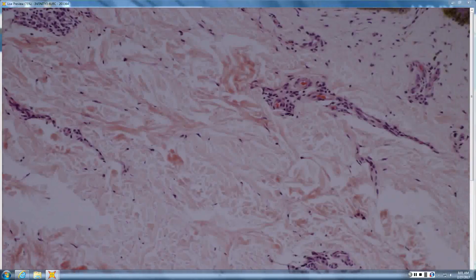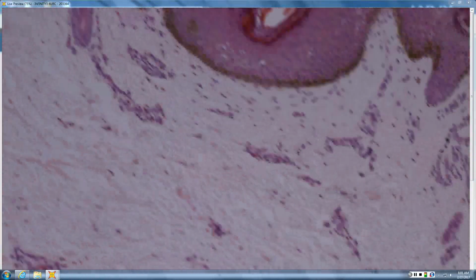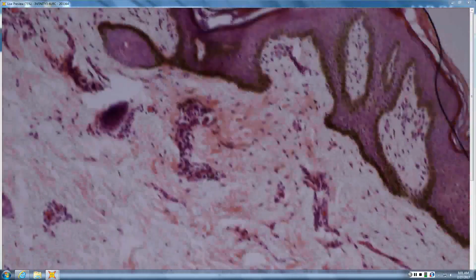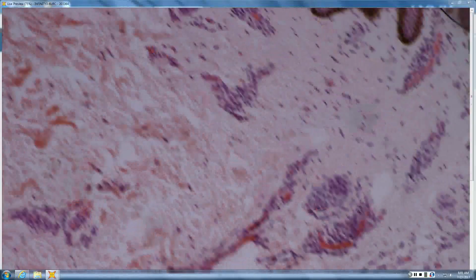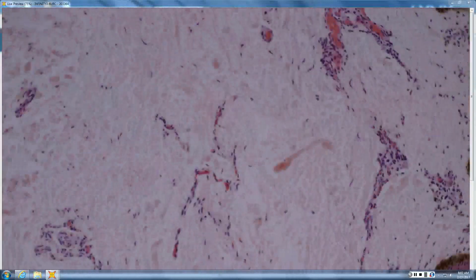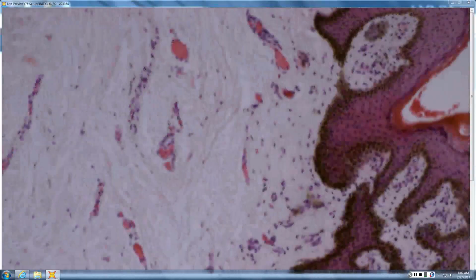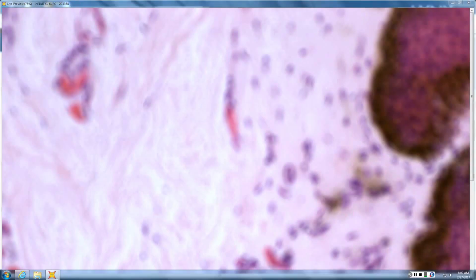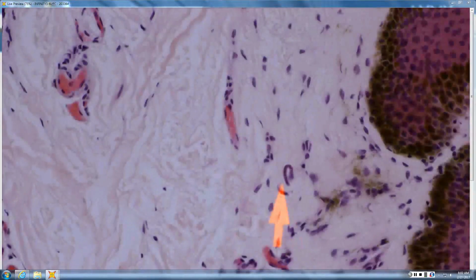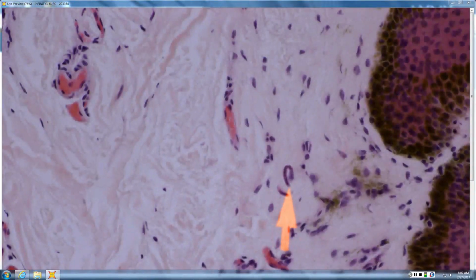Are we looking for filariasis? Well, we're looking for something, right? Let's see if it will cooperate. There we go. See that little guy there? I feel like that's a blood vessel. Like scan.